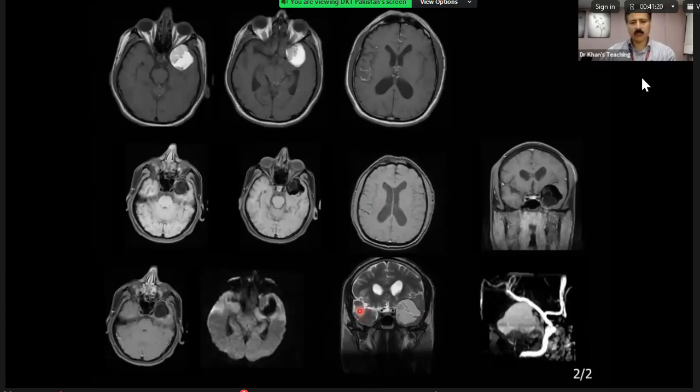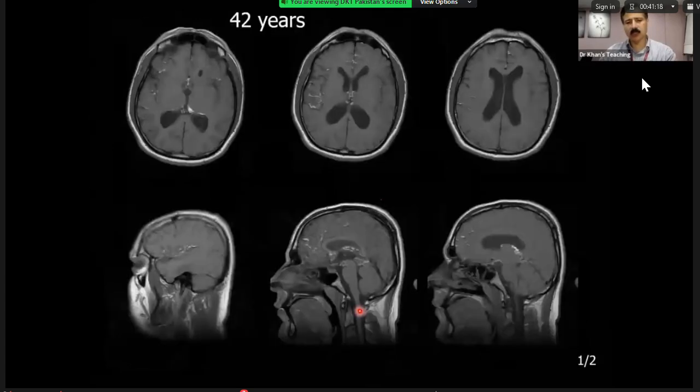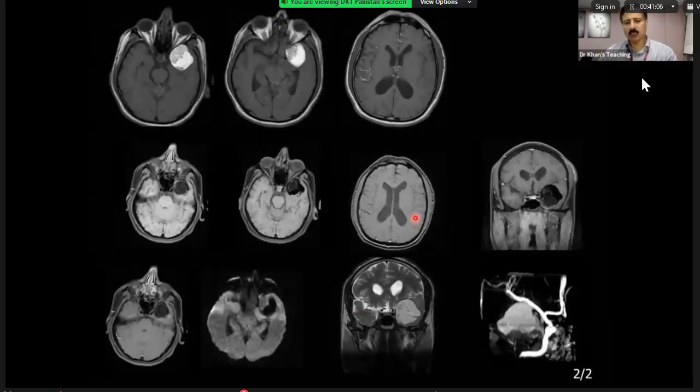Let me tell you the teaching points. Now, the point is here, I just selected some images just for you to stretch your imagination. I had not shown you everything intentionally. Ruptured dermoid, if you see here, this is a ruptured dermoid. So on this is fat and a fat saturated sequence. It shows signal dropout. Please remember, how do you differentiate a lipoma from a dermoid?